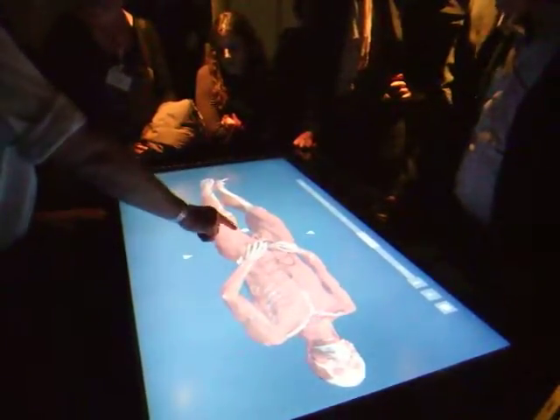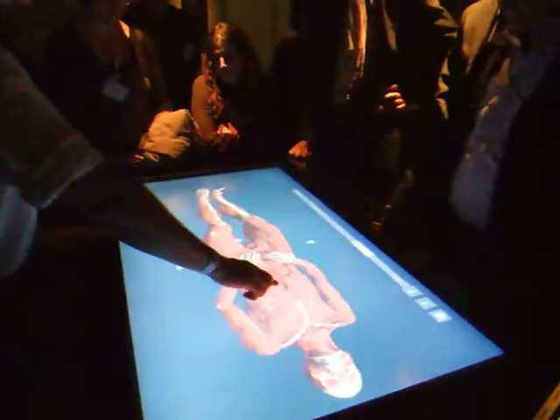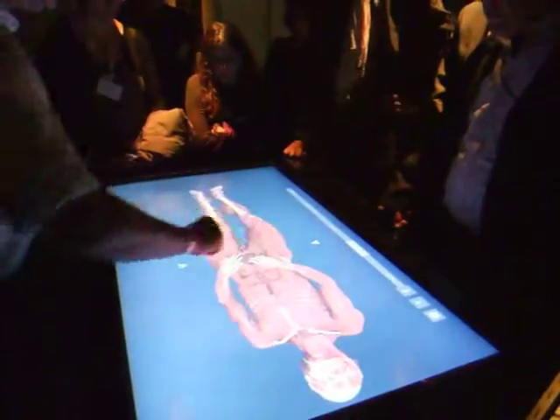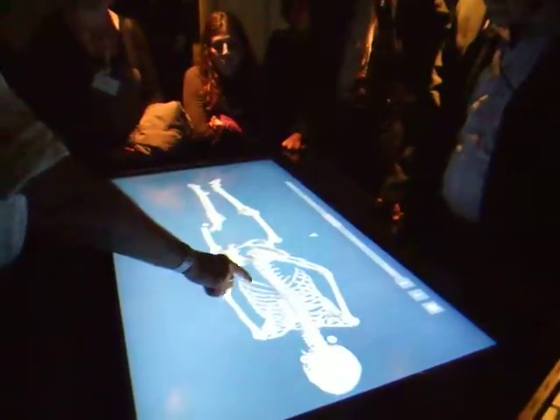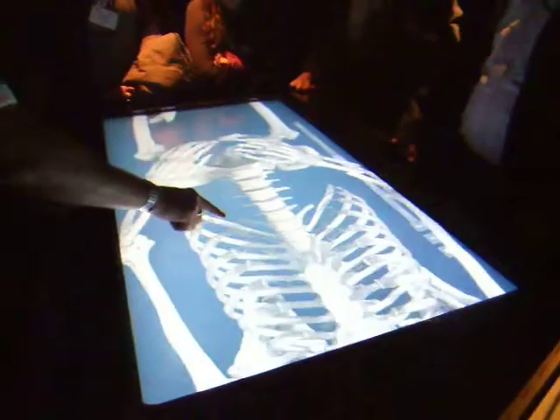It's quite substantial. It's not actually a compound fracture, it's still inside the skin, but it's ruptured the muscle surface. It's quite traumatic. You can see there's also a break there. That doesn't look quite right either, so there's clearly lots of bone damage. We can go in and have another look at that. You can see the detail in the data. It's very high resolution. It's like real texture on the surfaces of the bones.